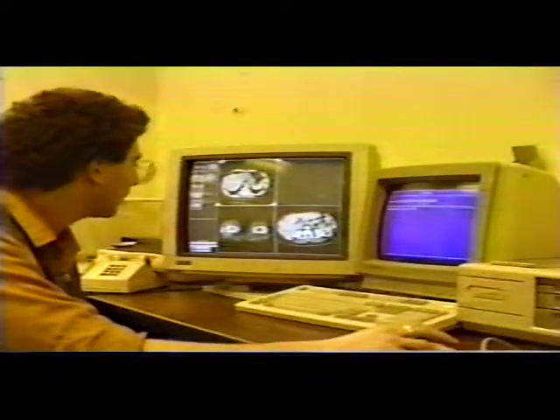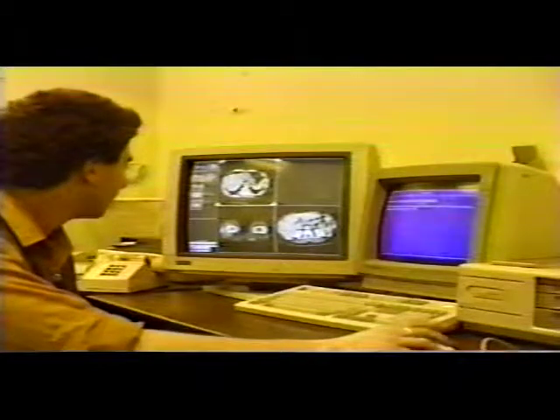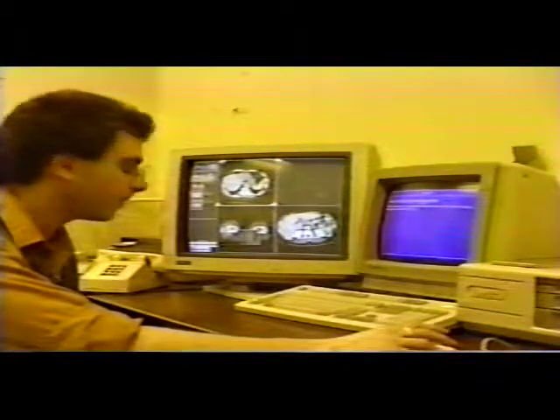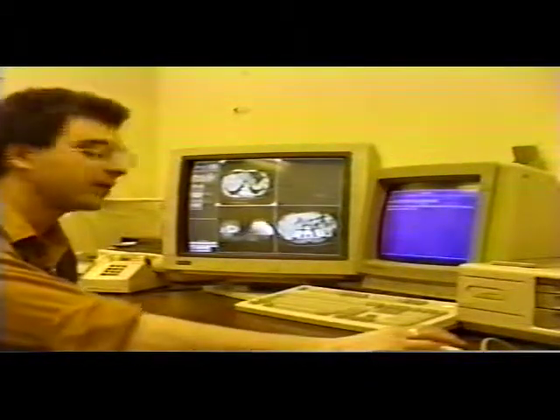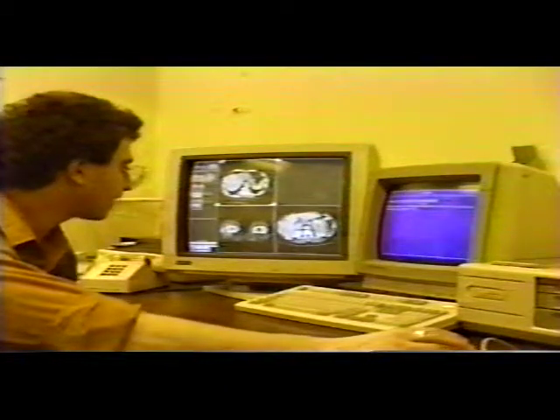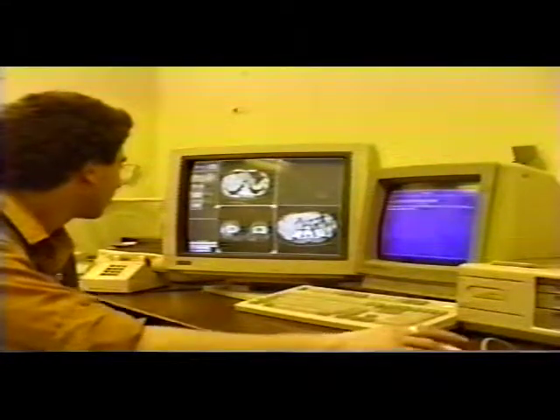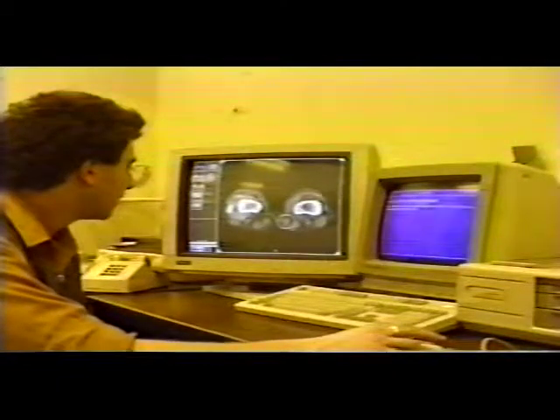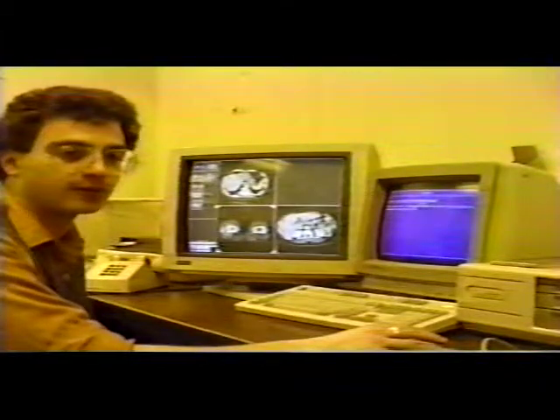If we're very interested in that region of interest, I can use the right mouse button and bring up the magnifying glass. Clicking a second time triples the magnification, and another time is 4x. We can look around at different images on the screen with this high magnification or low magnification. Or if we are really interested in this image, we can zoom and make it fill the screen. Click on zoom out and it repaints the screen. Again, this transfers directly from the optical disc.